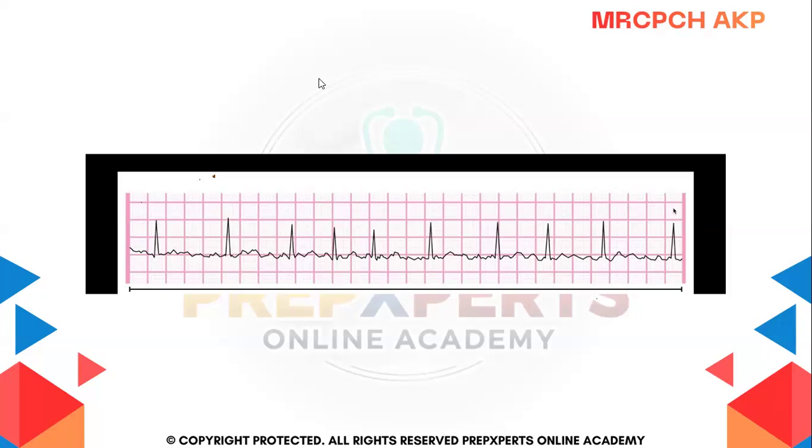So basically what you're going to do is you count the number of R waves. So what are the number of R waves?